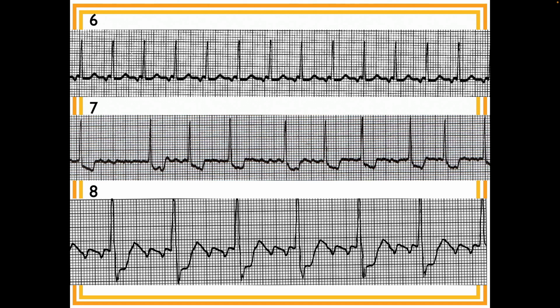Questions? Are there retrograde P waves in that? No. So those little notches, after the third QRS. Third QRS, 1, 2. This? Yeah. No. This? Yeah. Okay. Does anybody know what that is? Is that the biphasic... Yes, you got the right idea. You didn't say it all that great, but you got the right idea.